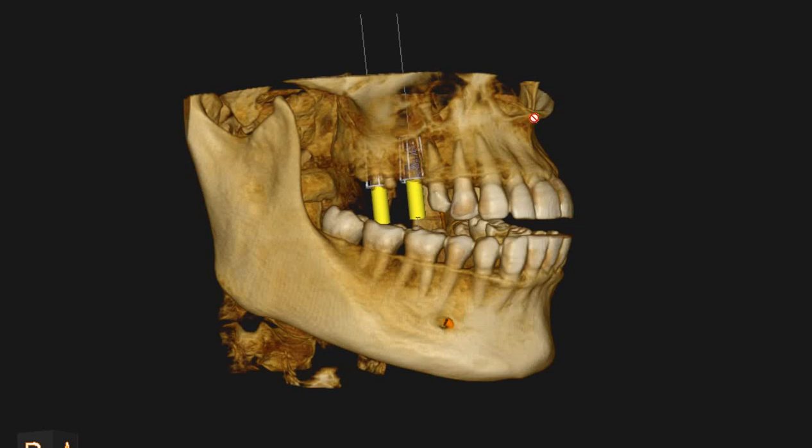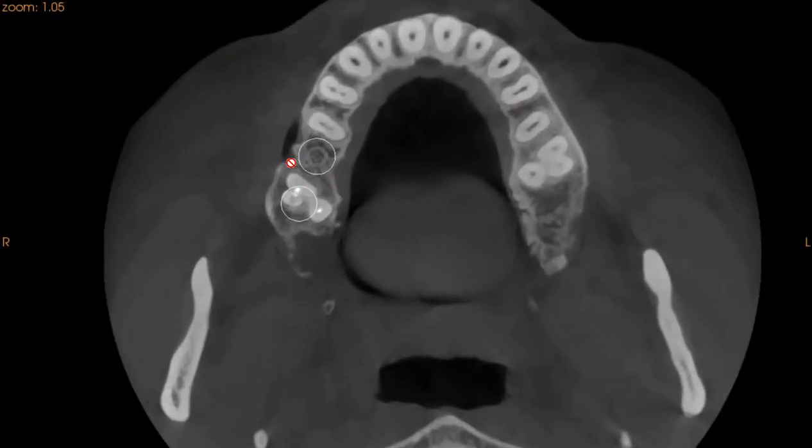Now on the axial view, we can see that the implants are placed right in the center here. The implants are going to be extremely helpful in this region if placed in the center because they will have good bone support 360 degrees all around, so that the osseointegration can be very well accepted.